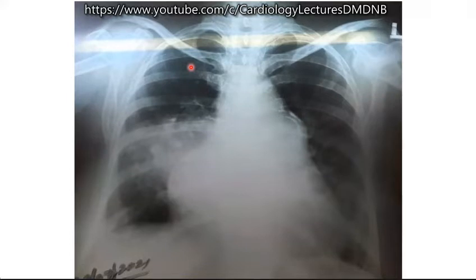Very good. Excellent. Okay. Sir, here there is a slight cardiomegaly, sir. Slight. Okay. So with slight cardiomegaly with Eisenmenger features, it goes in favor of ASD, sir. The cardiomegaly with Eisenmenger feature is more in favor of ASD. I agree with you. Okay. What about the aorta in this patient? But the aorta is not prominent, sir.